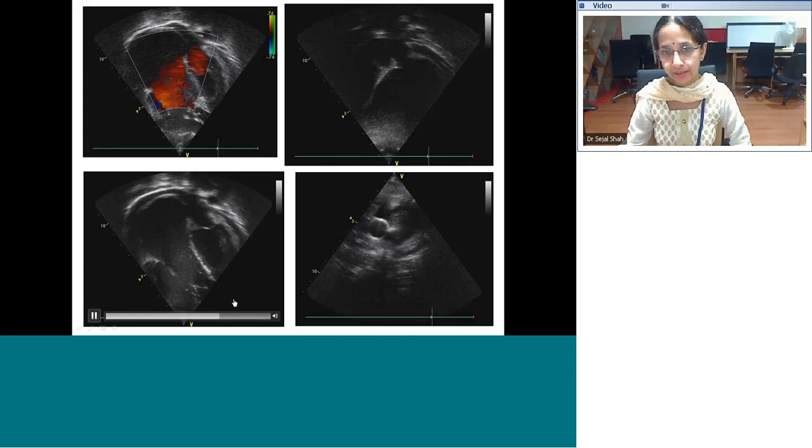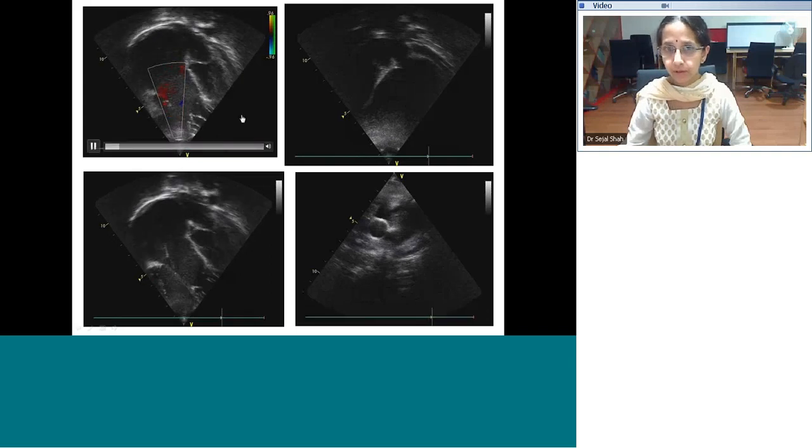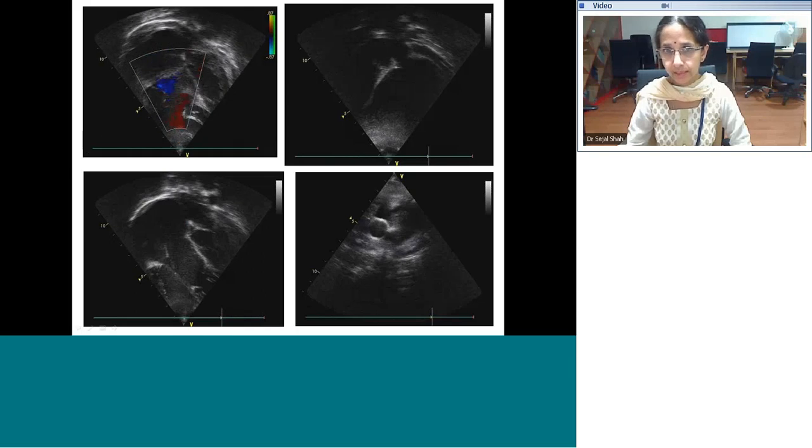See, this is the 4-chamber view. What is the characteristic feature of Ebstein's anomaly? Okay, is this seen very clearly? Where is the septal leaflet? Grossly dilated right heart. That's right. And the most common, we are so used to seeing Ebstein's: displacement of the STL. So can you see here the STL?